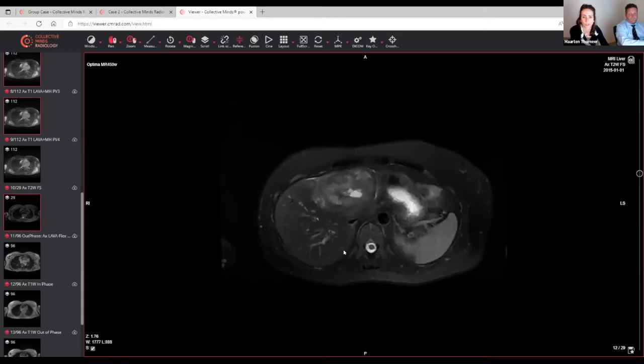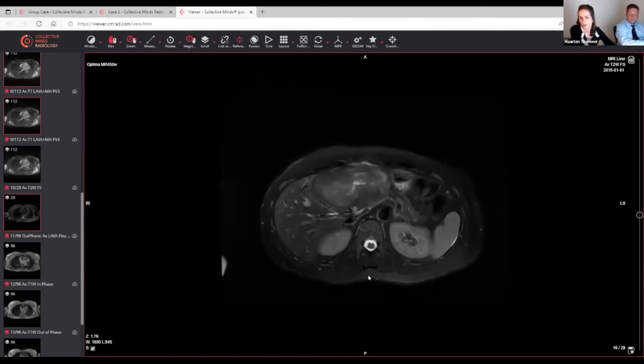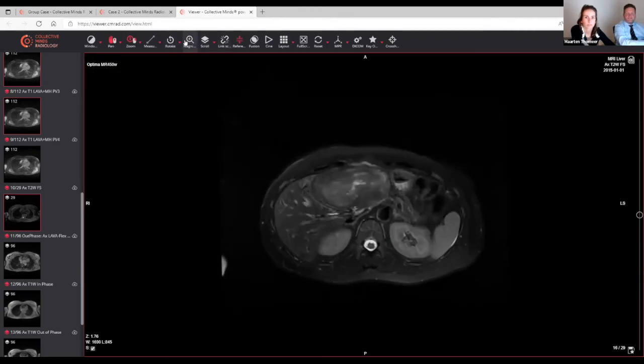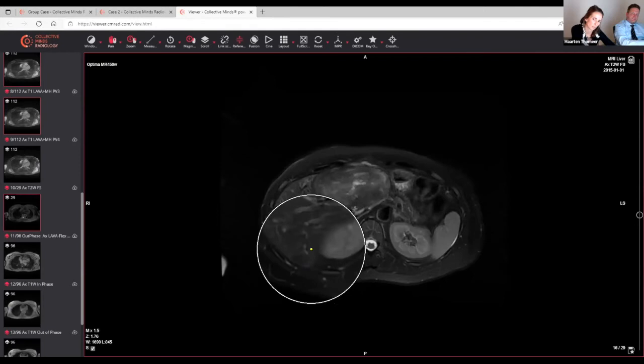Okay. Do you see other lesions? Yeah, there was one other lesion in this case, and I think it's over here. Can you enlarge it more? Yeah, and then magnify. Again, push and magnify. Yeah, it's over here, but it's a small hypointense lesion on T2, so over here.